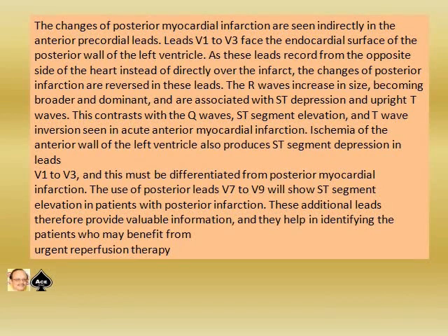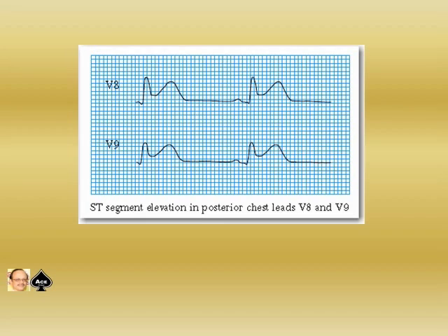The use of posterior leads V7, V8, V9 will show ST segment elevation in patients with posterior infarction. These additional leads therefore provide valuable information. They help in identifying the patients who may benefit from urgent reperfusion therapy. And this picture shows the ST segment elevation in the posterior leads V8 and V9.